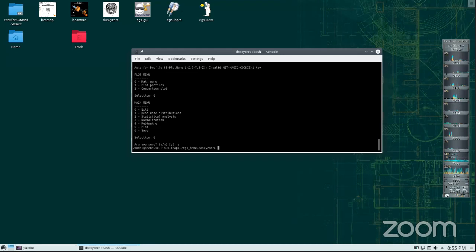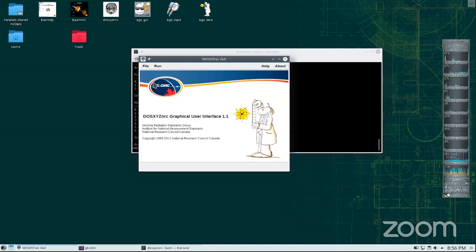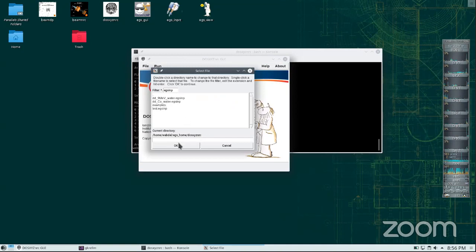There's another question. What does it mean by incident beam size, which was set to 100? What's that? Where is this? I don't see it here. I think it's in the parameters when you edit the source file. Yeah, I guess so. Look, the best thing is, it does have actually a very nice help file, right? So my suggestion is you just go and read what's there.